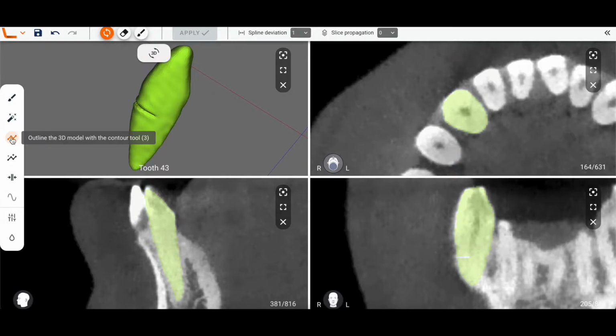Now once you've selected the contour tool, you'll see that a series of settings have popped up on the top bar. The first one is the adapt mode, which is great to make changes to an existing segmentation, like the one created by the AI or manually by yourself. You can also put it in erase mode in order to erase everything that is inside of the volume of the contour. And finally, you can also put it in paint mode, which is ideal when you want to label from scratch.